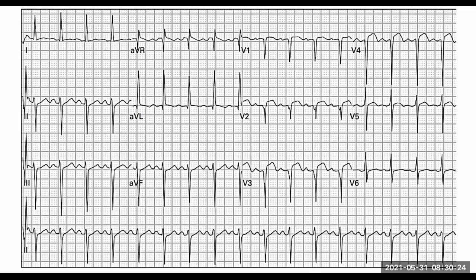What do we see? Suppose we can talk about that. What is this? ST, that's the ST segment, all right? Is it above or below? So we've got an ST elevation, very good.